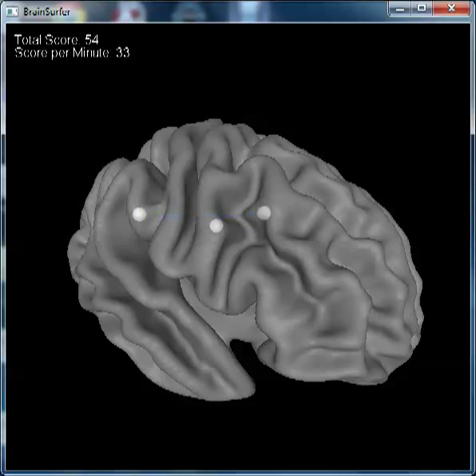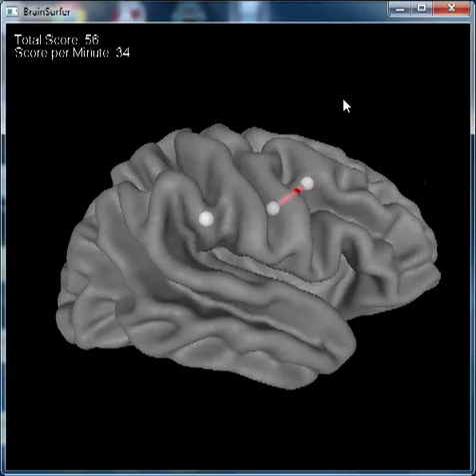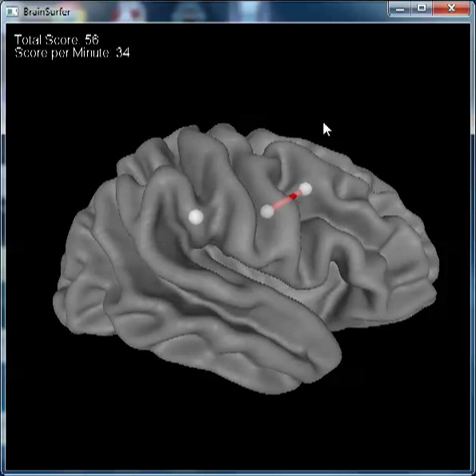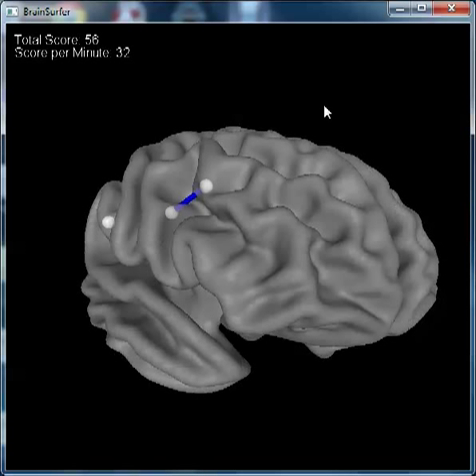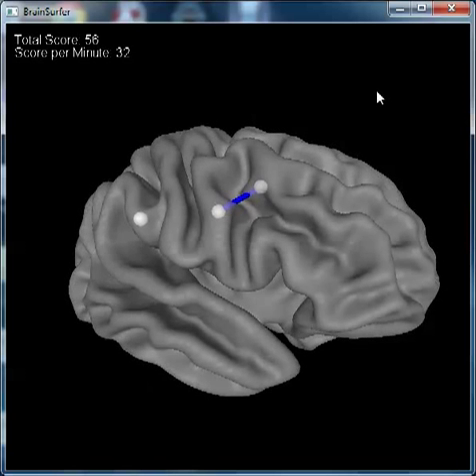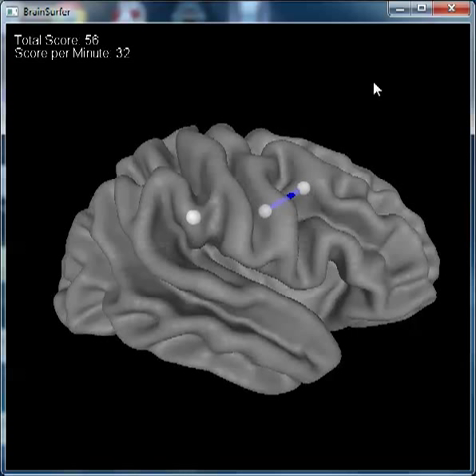We can also evaluate things like phase shift duration. That's what's being seen here. That's the time it takes to allocate resources in the network. And we can train the brain to become more efficient by allocating more resource. We can look at phase lock duration. That's the period of time that clusters of neurons, particularly these Brodmann areas and networks, are involved in synchronized communication and information processing.